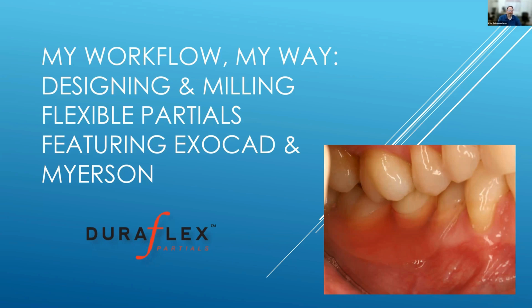Whereas on the digital side, the learning curve, and the reason digital is so popular, is it's just faster to learn. And so I jumped on really, really early with the digital design for flexibles, before really Exocad or 3Shape had workable workflows. They were kind of workarounds all the way through the process. Now with the software, there's still some things I'll show you to make things work better that are still small workarounds, but there is a workflow in place for flexible partials. And we're going to show that today.